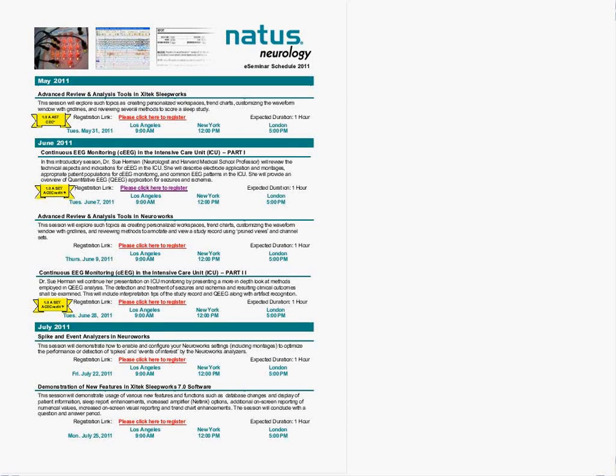During this session, we will be reviewing the analyzer settings, and we will go through the parameters that are applicable to each of the analyzers. This will give you an opportunity to submit any questions that you might have with respect to how you're using the analyzers, and you'll have an opportunity to submit a question to one of the chief programmers, who will be available to respond to your inquiries.